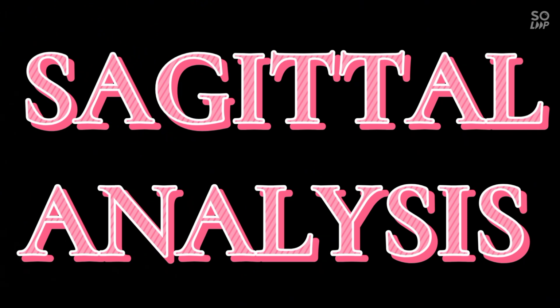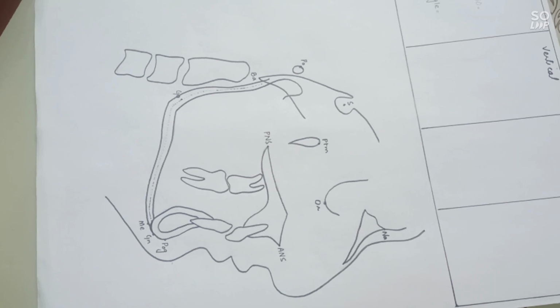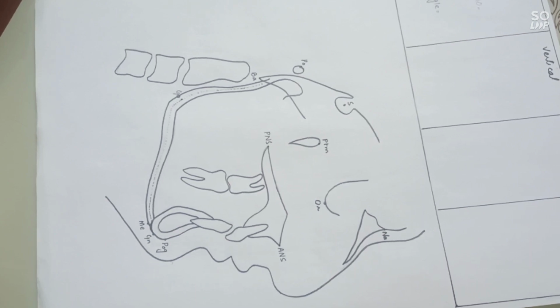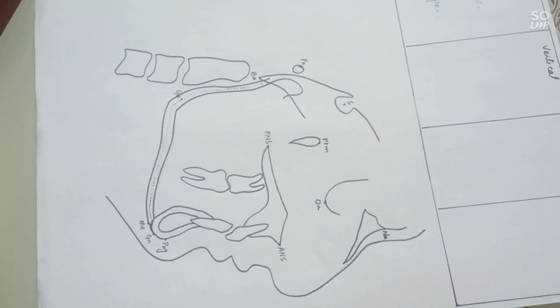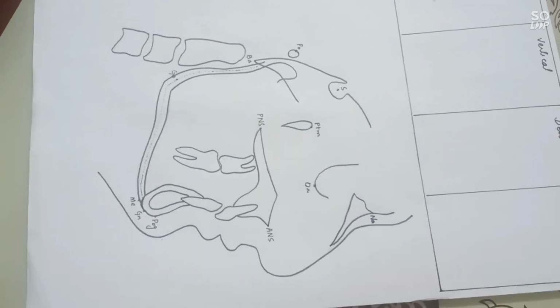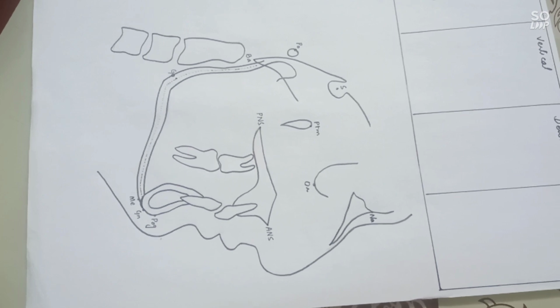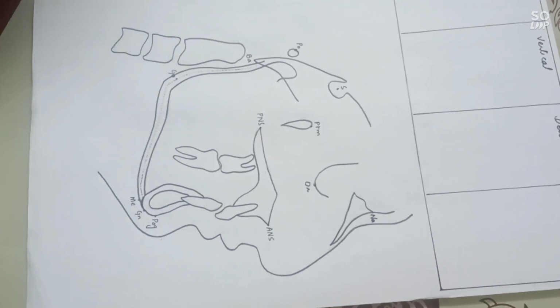So let's get started. In my previous video, we discussed the landmarks of the cephalometric analysis. All these landmarks will help us in our later analyses, that is the sagittal, vertical, dental and soft tissue. For all these analyses, we need to draw 5 horizontal planes, namely the SN plane, the Frankfurt horizontal plane, the maxillary or palatal plane, the occlusal plane, and the mandibular plane.